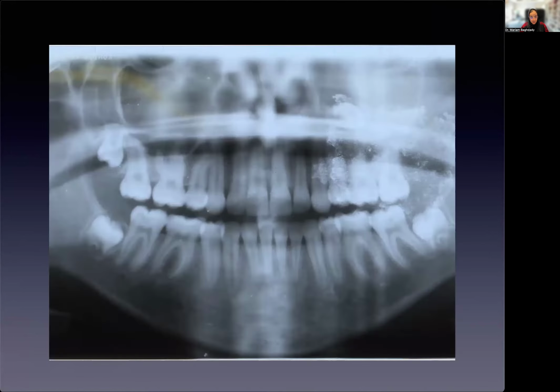And I'm going to show you this particular case. That was actually a court case. I took permission, by the way, to use this for teaching purposes. So this is a patient that was going to her orthodontist. This is a little further back, but I can imagine it happening also with earrings. It can have the same effect.